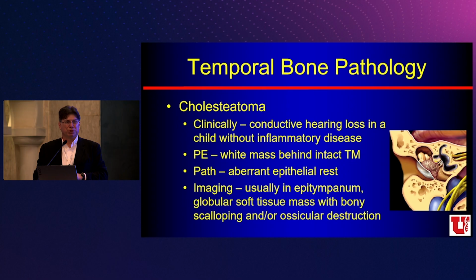So as you heard this morning, we think very closely about CT scans in those axial sections. We want to see a good ice cream cone and then 2 dots, a colon, and then kind of an equal sign down lower. So we want to evaluate those ossicles and see if they're all there and look normal. If there's any pathology that may be obstructing their motion, they may have conductive hearing loss.